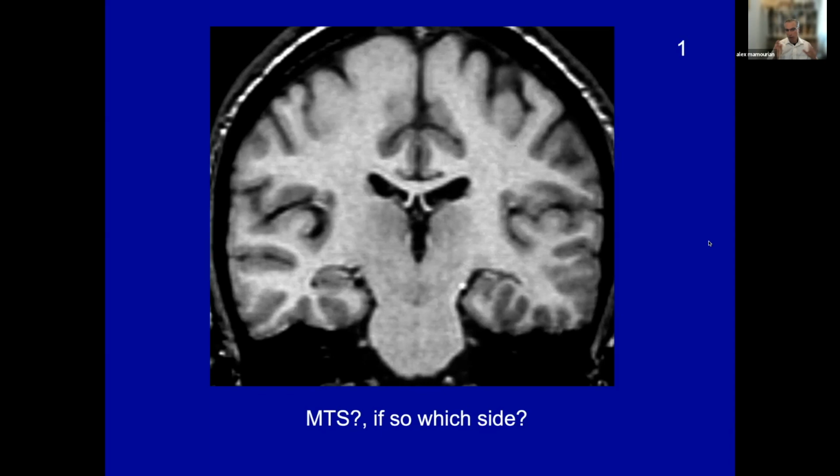And I'm only going to show you one image, and obviously I would pick a representative image, and this is our case one. And I want you to respond to this poll. Do you think this patient has mesial temporal sclerosis? And if you do, which side is it on?